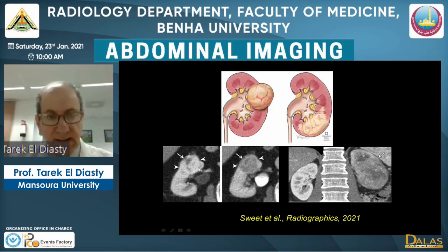Here is a renal cell carcinoma with a well-defined outline with enhancement after contrast administration in the nephrographic phase, and this is the excretory phase image with a washout of contrast, and still the outline can be seen. This pattern is displacing rather than infiltrating the renal parenchyma.